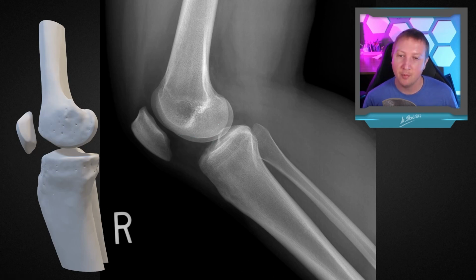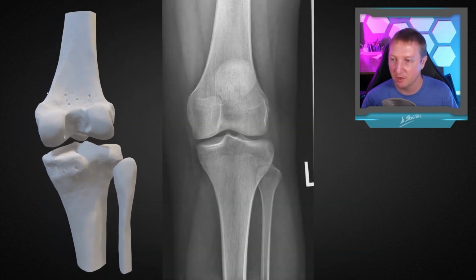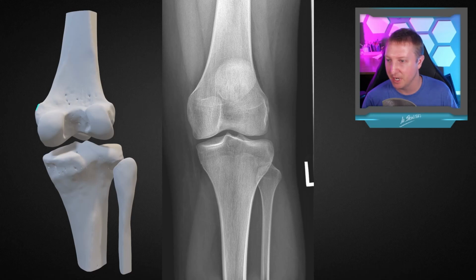All right, and so our condyles, of course, curve up here, and then depending on how oblique they are, sometimes you can see the gastroc attachments here a little bit more prominently, and maybe even the medial adductor tubercle, which I actually forgot to mention on the last view. So this is our adductor tubercle here, and depending on the size of it, in this case, pretty normal size, we don't see it that well, but sometimes you'll see that project a little bit more prominently, and that's also a normal anatomic finding.